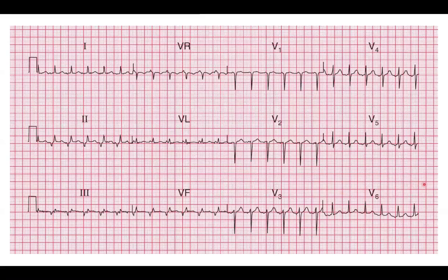All right, so this is our last EKG here. So same as before, just go ahead and pause and take a look at what you think may be going on.